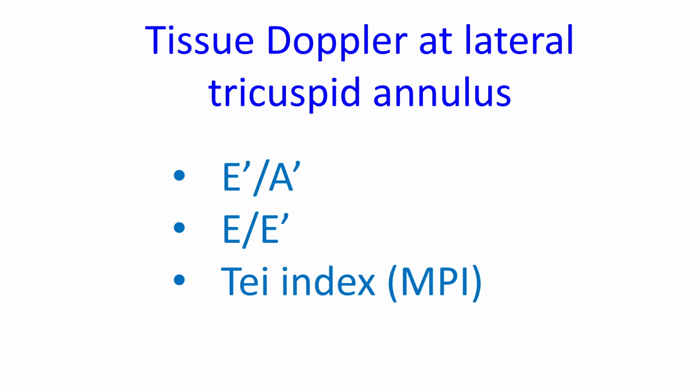It may be noted that tricuspid inflow is highly sensitive to preload, afterload, and phase of respiration. Hence, averaging 5 consecutive beats or measurement in held expiration have been recommended. As on the left side, absence of A wave in atrial fibrillation would mean that the E/A ratio cannot be measured.